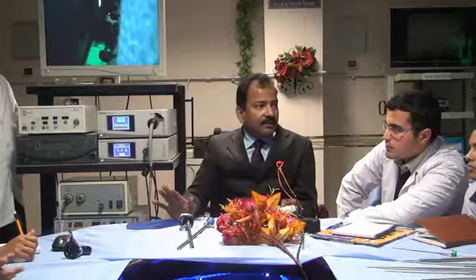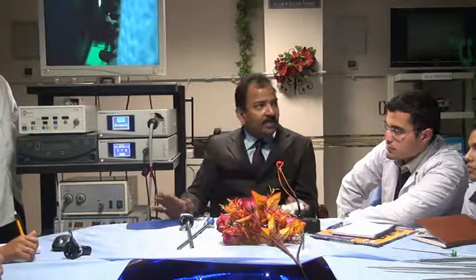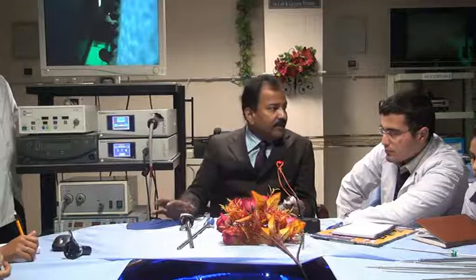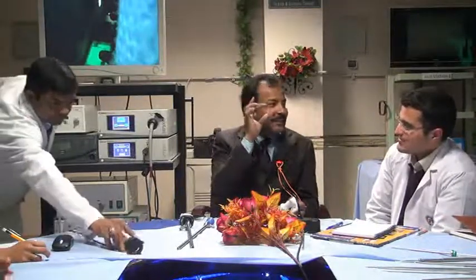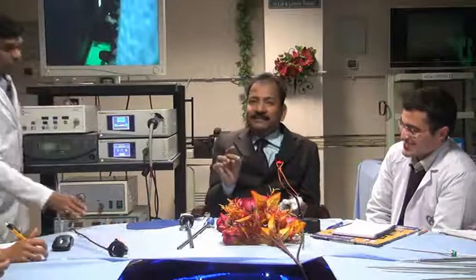It will be neutral, it will be natural. See it as natural, as it should be. Bile should look like bile, blood should look like blood. It should not be influenced by the impurity. Just like in his glasses, if I put betadine, he will see all our faces yellow. Because the problem is not with our face, the problem is with his aspect. So if there is white balancing in his aspect, he gets balanced.